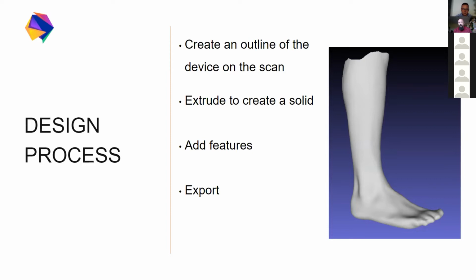Once those are added, confirmed, and compared against the scan, you can export that, and then it goes to manufacturing, and everything follows more conventional processes from there.